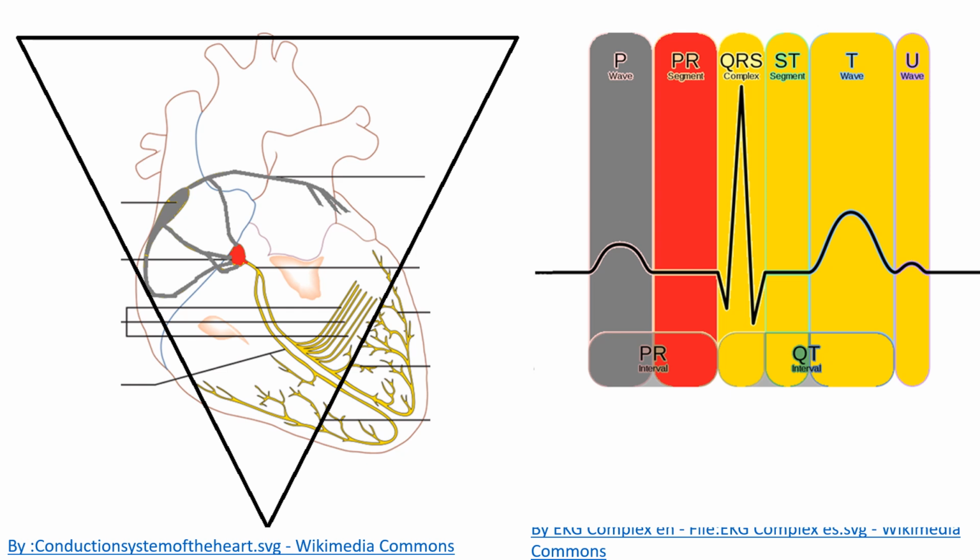And so your PR interval becomes normal to maybe long, but you get longer, longer, longer, and then drop, right? And you might drop more than one QRS in a row. So that's what's happening right there. So the blockage is going to be in that AV node right there, so it's going to be above the His-Purkinje branch.